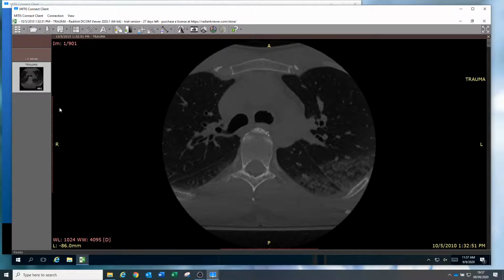What you've just seen is the illustration of the DICOM image loading in the workstation at the hospital and communicating to the PACS machine also within the highly connected network.